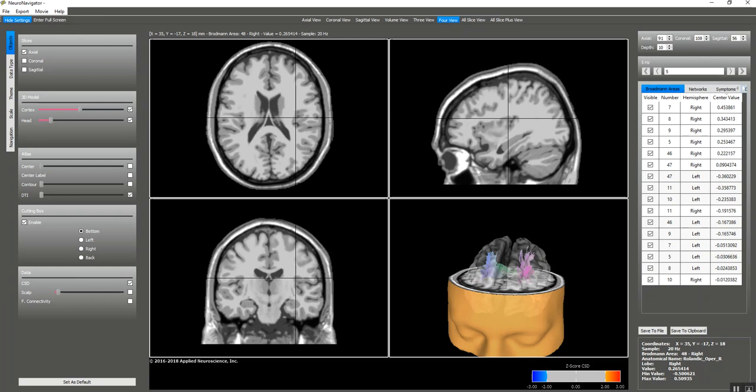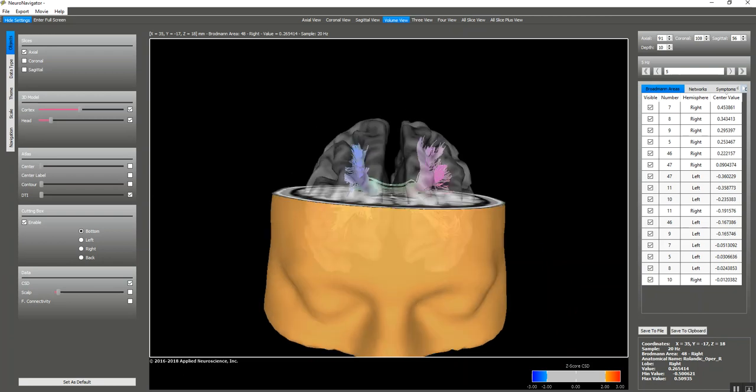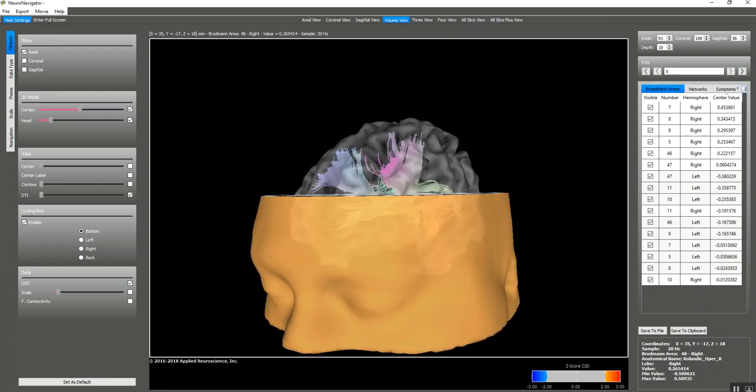The raw scores are especially good for gross pathologies, epilepsy, spikes and waves, sharp waves, or anything that is suspicious from the EEG. It gives you an idea of where those deviations from normal are. And you can then link patient symptoms to dysregulation in the brain, based upon the severity of the symptoms.